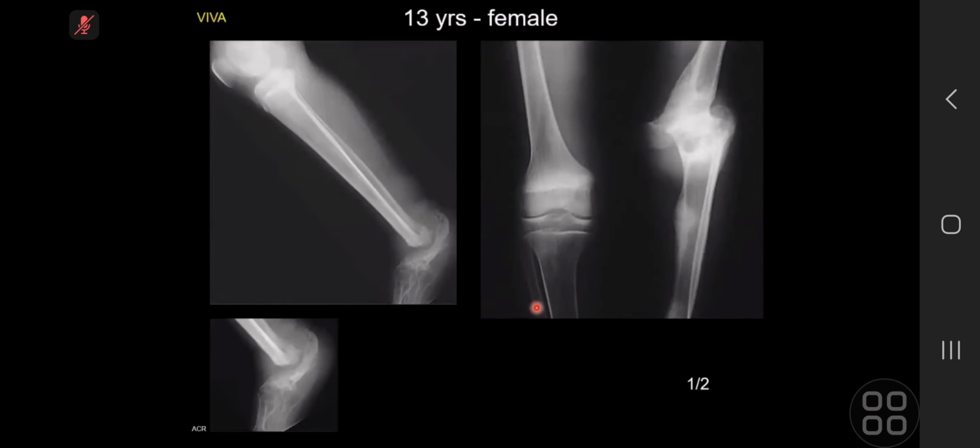So this is a radiograph of both knees, tibia and fibula and foot. There's complete deformity of the left knee joint, which has a bizarre appearance with increased sclerosis and expansion of the joint. There's also destruction of the talotibial joint on the left-hand side. The right joint appears to be preserved, with no abnormality on the right-hand side.